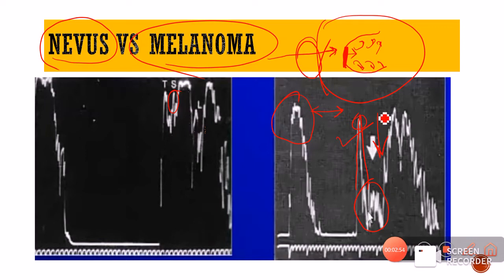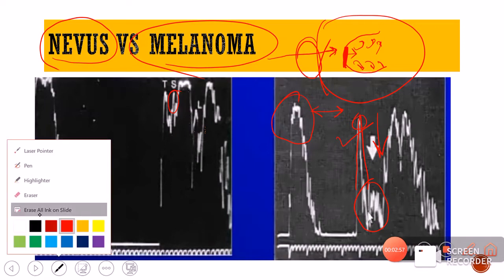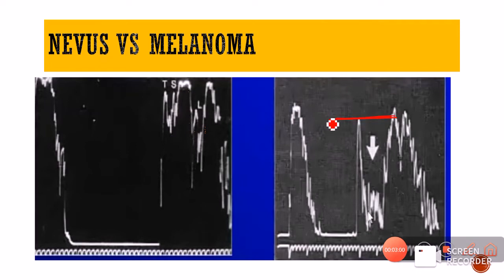So if you draw a line from the top of this peak and trace it to these downward dropping low spikes, we are going to find an angle of attenuation, and that angle of attenuation is called angle kappa. Now the greater the angle kappa, the greater the attenuating capacity of the medium. I have explained angle kappa in the video on the basics of B-scan, so if you want, you can visit that video again and clarify your concepts.